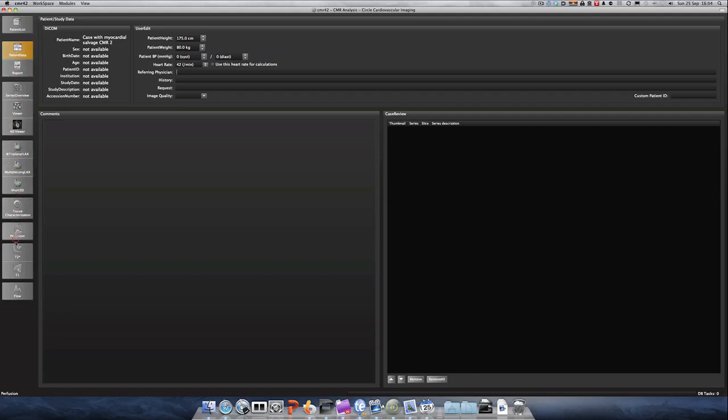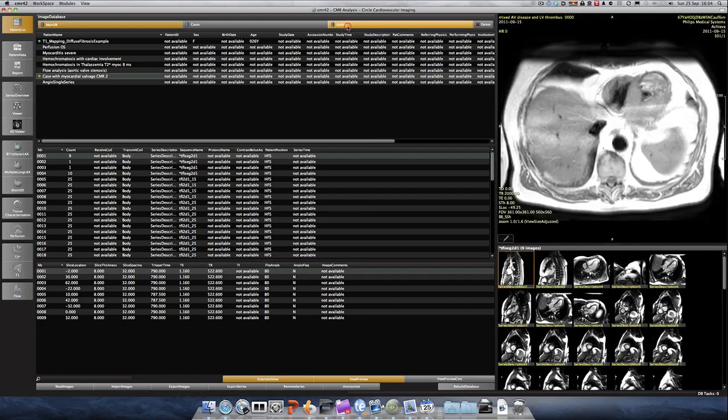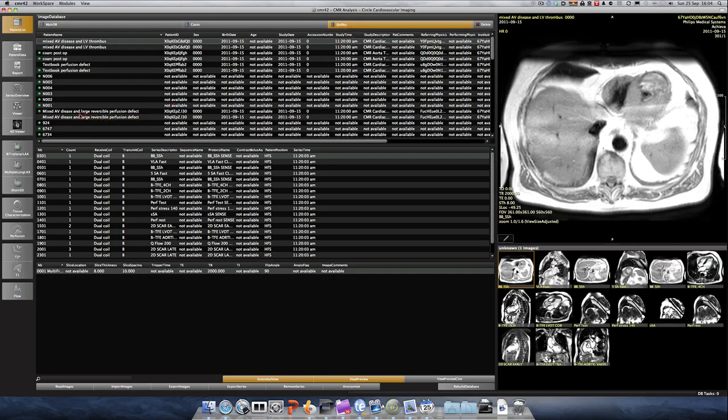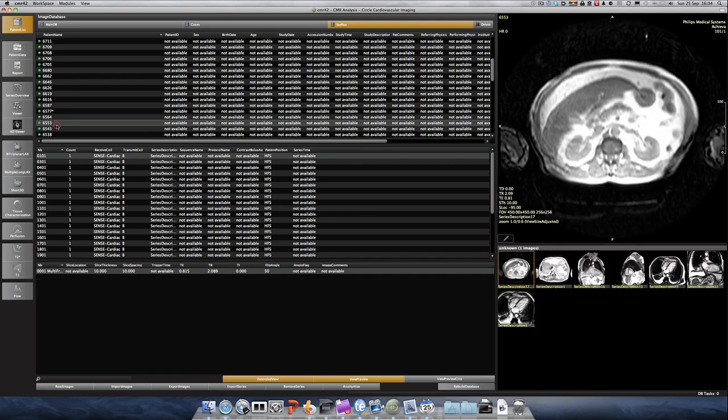Right, I think that's really what I wanted to say about the RV, but I did promise that we'd look at a few other short axis scenes just to discuss where to draw the basal slice. That's really critical. So let's go into some perfusion cases, because they should pretty much all have the cines, I would hope.